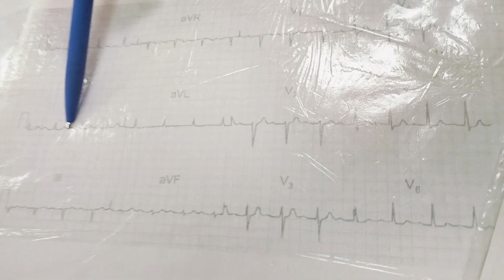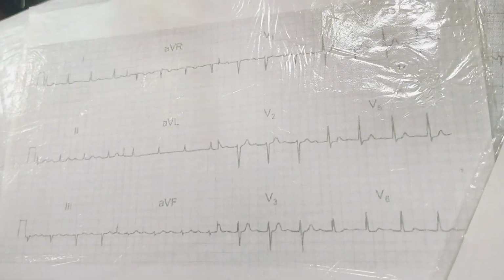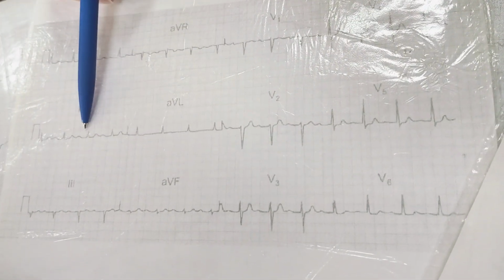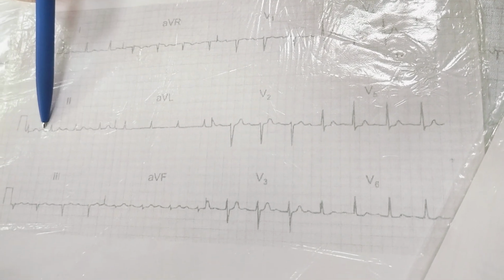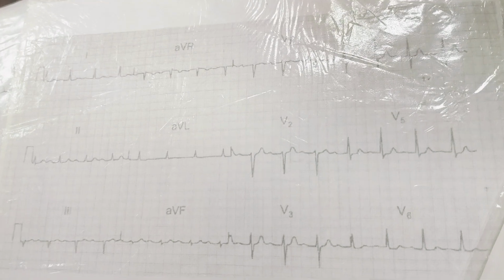There is tachycardia, there is no isoelectric line between complexes. Tachycardia with narrow complexes, P waves are present. Sinus tachycardia.